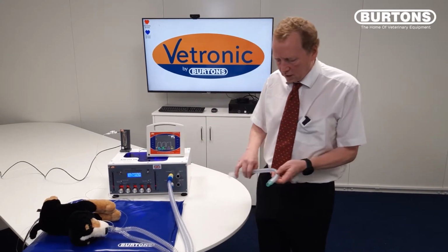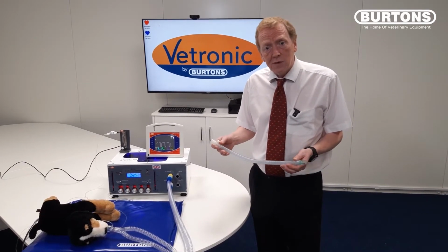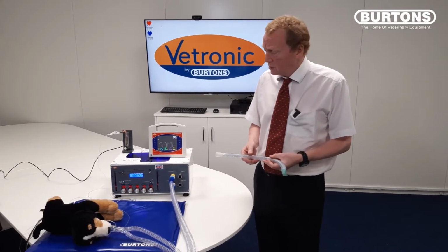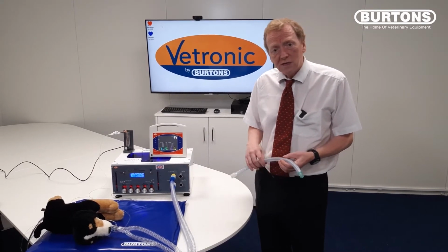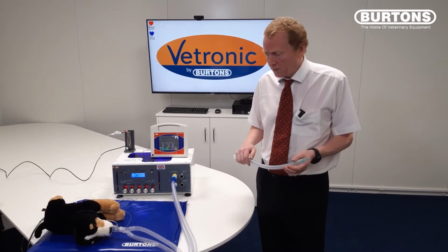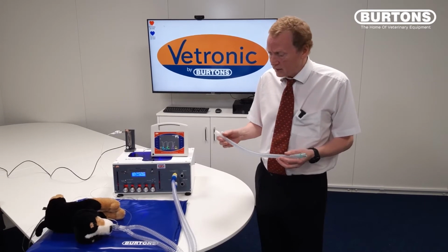What I have here is a bit of 30-40 centimetre smoothbore tubing. It's about 15 millimetres diameter and represents about 60 mils of dead space. The tidal volume of my patient is a little over 200 mils, so this is approximating 25% of its tidal volume.